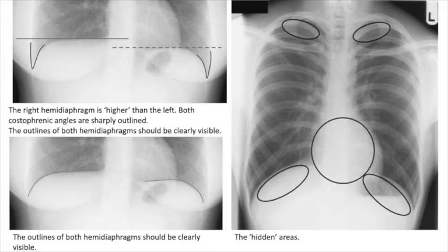Sometimes you have a patient with signs and symptoms of maybe pneumonia or another type of disease, and when you look at the X-ray it is negative. So you can think that maybe it's behind the heart, or it's not visible because of the liver or the spleen. It's very important to know that. You can request a lateral X-ray in this case.